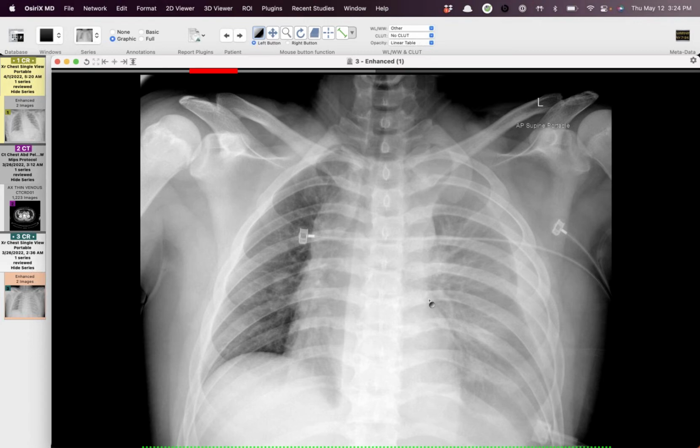We have several traumatic aortic injuries here, but this one in particular is a good example because I think everybody jumps on the fact that there's a layering left pleural effusion here, and probably a deep sulcus sign. We don't really get down there, but you've got some lucency here, so it's probably a layering hydropneumothorax. And I think you can see the left heart border a little sharper than you would expect. But often we just attribute the pleural fluid medially along the mediastinum rather than mediastinal widening.